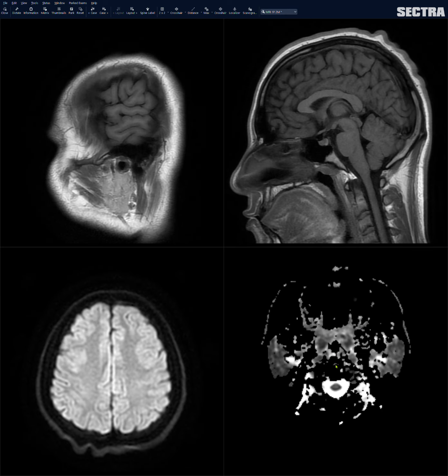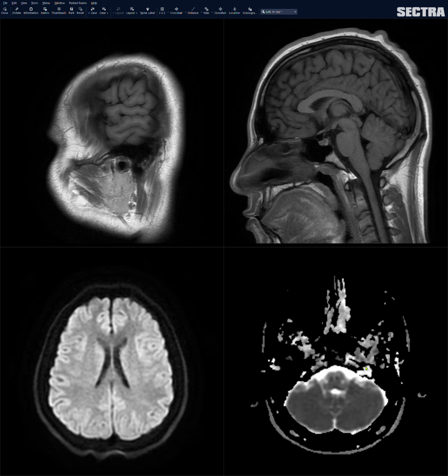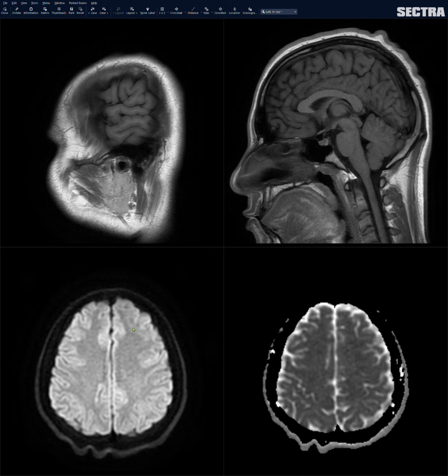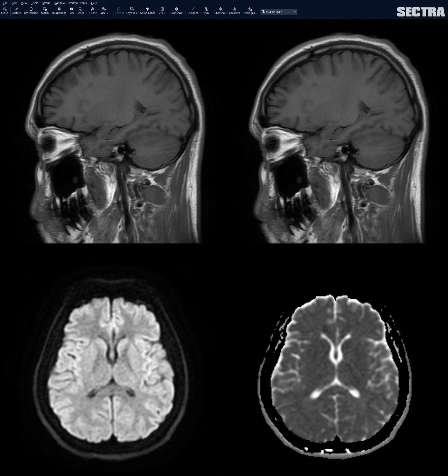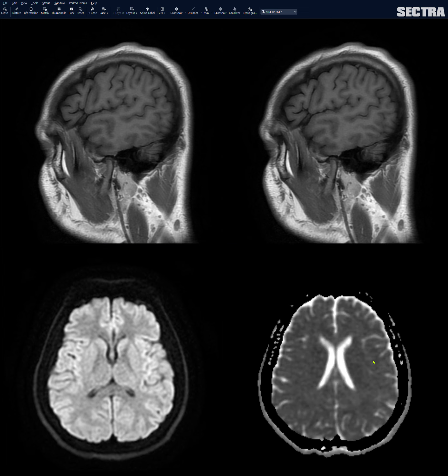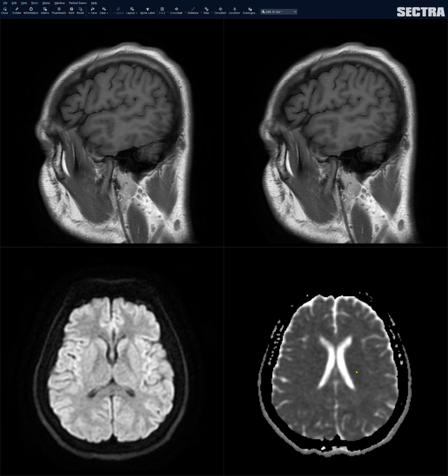And I get the ADC map right next to it. Usually if there's nothing on the DWI, then I pretty much just ignore the ADC map. But if I see something abnormal on the DWI, like a bright spot that I think is an acute infarction, then I try to correlate that. I use this little shortcut key to correlate it with the ADC map, to see if what is bright on DWI is in fact dark on ADC and is diffusion restricting. Sometimes if the patient is moving around a lot and you don't get a T2, the ADC map can be a poor man's T2.